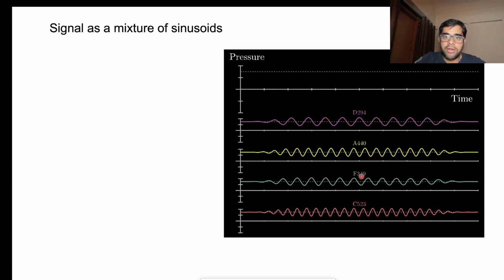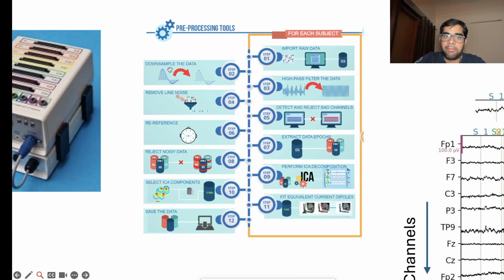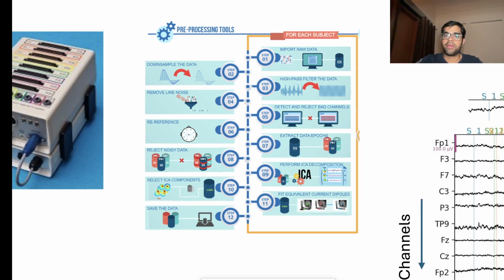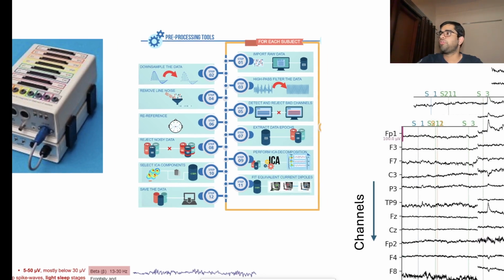So if you see here, yesterday as we discussed, this downsamples the data. While downsampling, you must keep in mind that the downsampling should not cause a problem while constructing the signal back. So you need to band limit using a low pass filter first, and then do the downsampling. It's also called an anti-aliasing filter, or if you don't do that, it will create an aliasing effect.